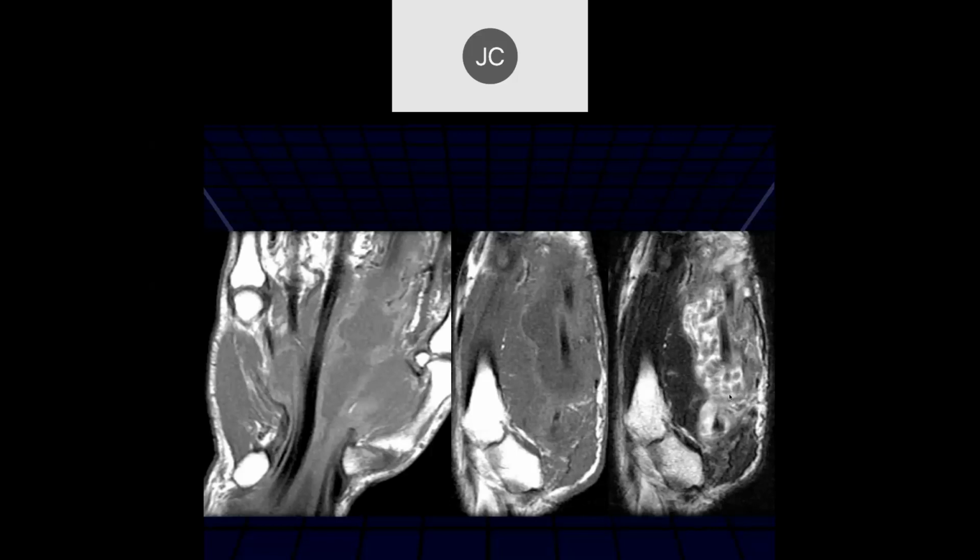You can think about rheumatoid arthritis, but we're talking about infections here, and this is not very typical of rheumatoid arthritis. So let's think about infections. What kind of infections might you think about? Guess some sort of fungal infection.